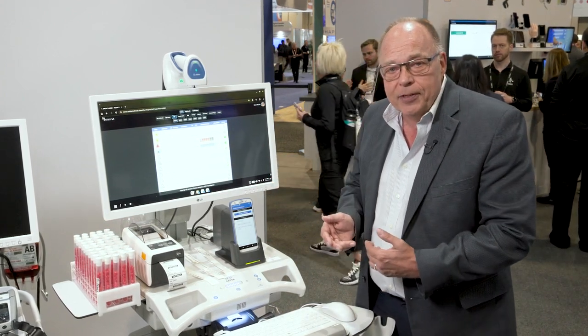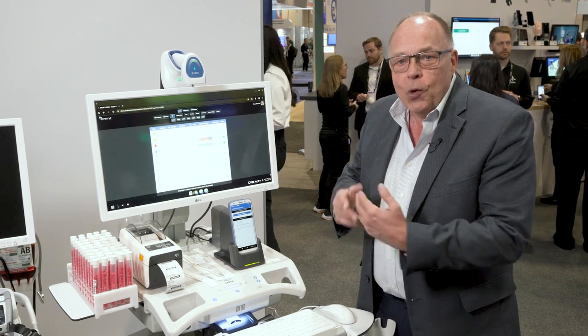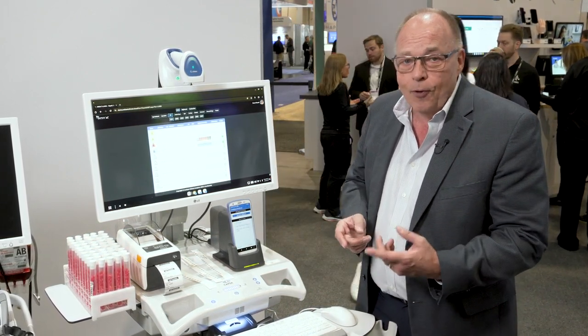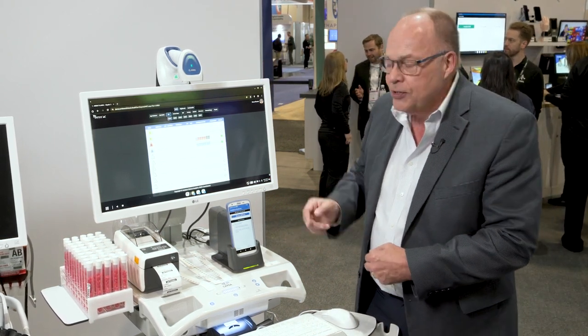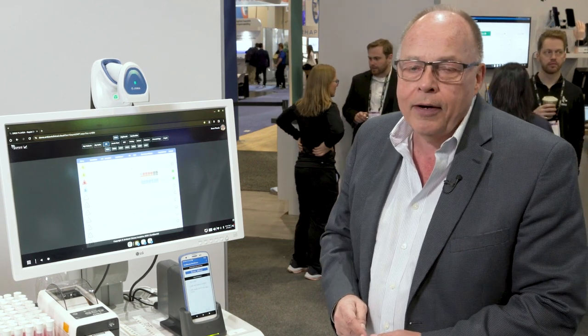So say you want antibiotics in a patient with sepsis within 60 minutes. Once that 60-minute threshold is crossed, we will remind people. We'll look in the record to see, have antibiotics been ordered? If they've not been ordered, we can remind the physician. If they are ordered and not delivered, we can directly remind the nurse. We'll track that for all the care elements and we can drive substantial improvements in overall care.